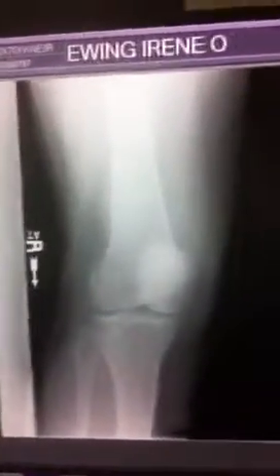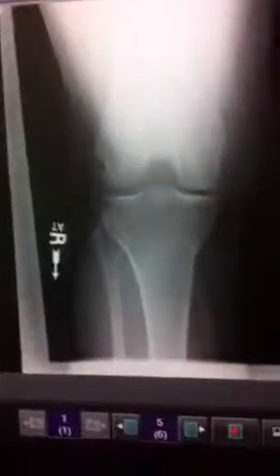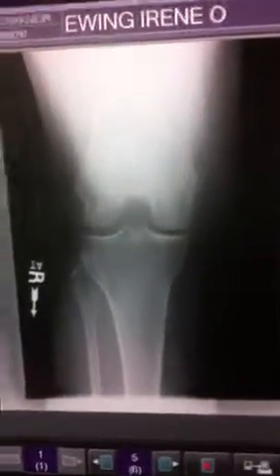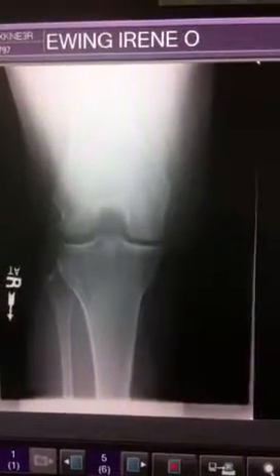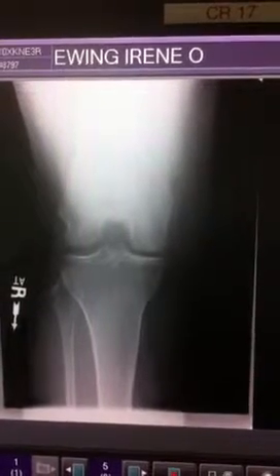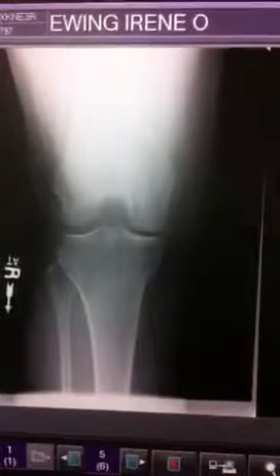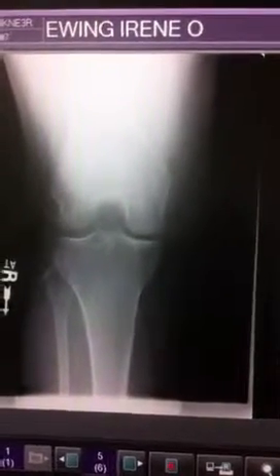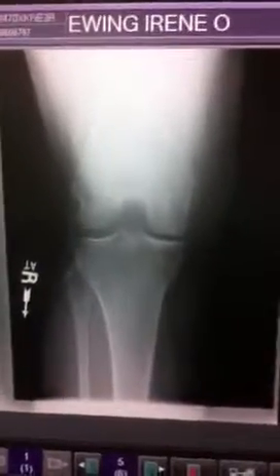For the intercondylar fossa, the Béclère method, the fossa should be open and visualized. The apex of the patella should not be projected into the fossa. The posterior surface of the femoral condyles should be visualized. The legs should not be rotated, as evidenced by slight overlap of the proximal tibia and fibula.